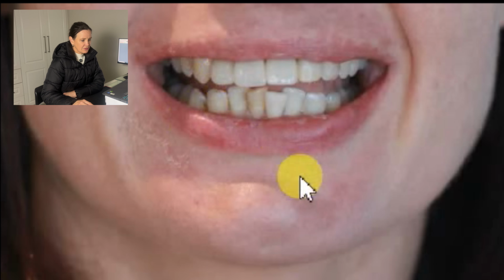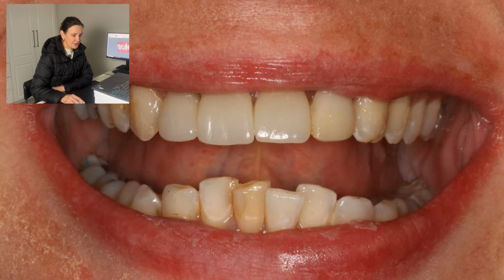The bottom teeth are the problem, and especially that one being dark makes the irregularity of the teeth even worse there. We'll get back to the deep curve and treating that. Profile-wise, the nose-lip relationship is really in a good position. The upper teeth support the upper lip, and the overjet, strangely enough, with how massive it is, is not really something that catches my eye.